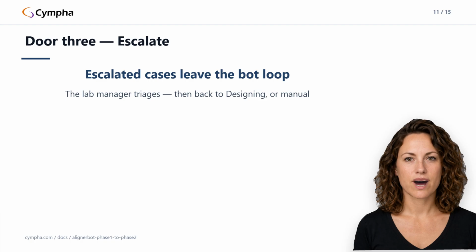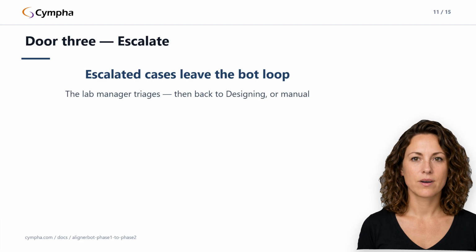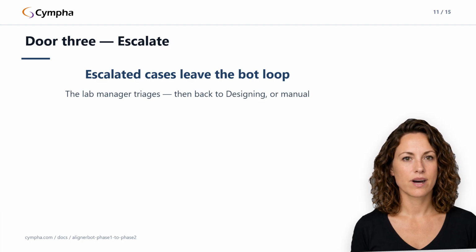And on the clinician's side, the case sits under delivered, ready for the natural next step, sharing the plan with the patient, which has its own guide in its own lecture. 6 things go wrong more than anything else, and they fall into 2 groups. This first group is about dispatch, the case not reaching the engine.